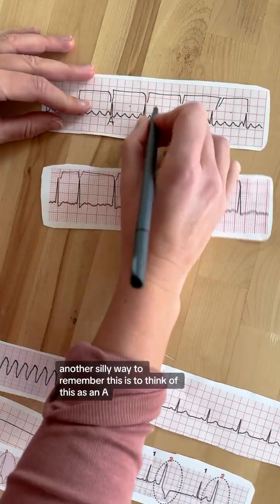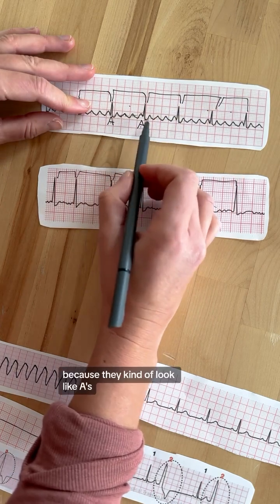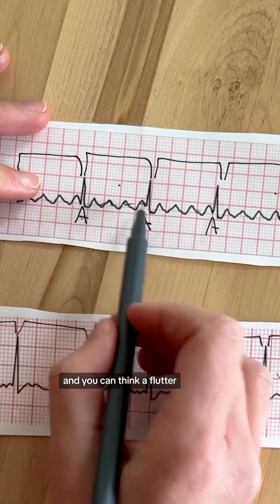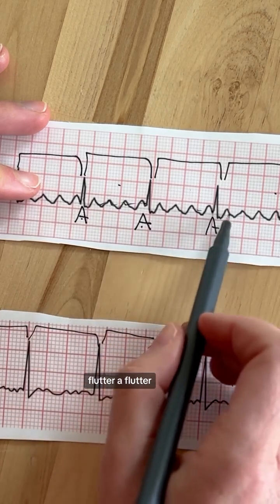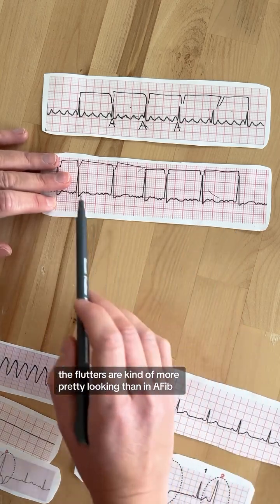Another silly way to remember this is to think of this as an A and this as an A because they kind of look like A's. And you can think A, flutter, flutter, flutter, A, flutter, flutter, flutter. The flutters are kind of more pretty looking than in AFib.